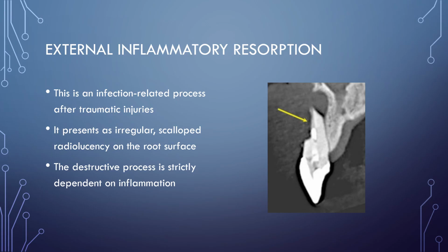Because this destructive process is entirely dependent on the inflammatory stimulus from a necrotic pulp, accurately identifying these external, scooped-out defects allows you to confidently diagnose the condition and plan for timely endodontic intervention to arrest the destruction.